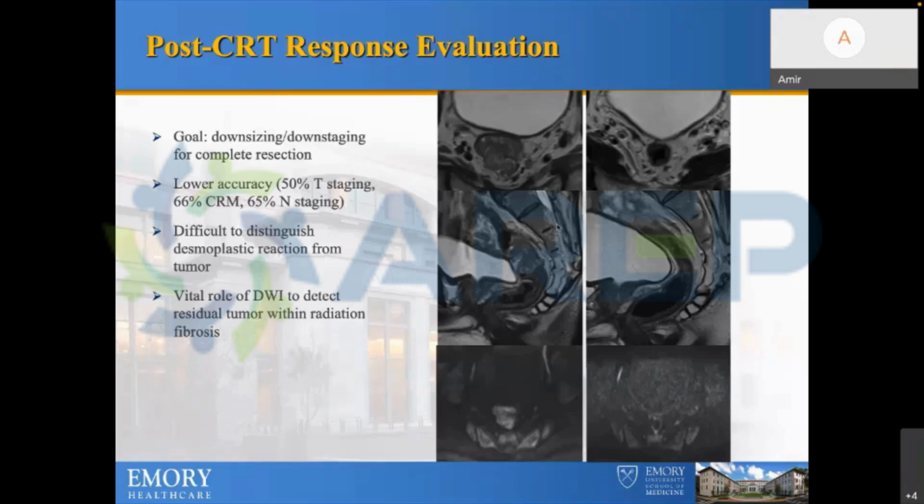And also, if you're evaluating the bone marrow, for example, there's a chance that there's a bone lesion. So having contrast sometimes helps, but just for the case of rectal cancer it is not super useful. Again, T2 is important and diffusion is very important.